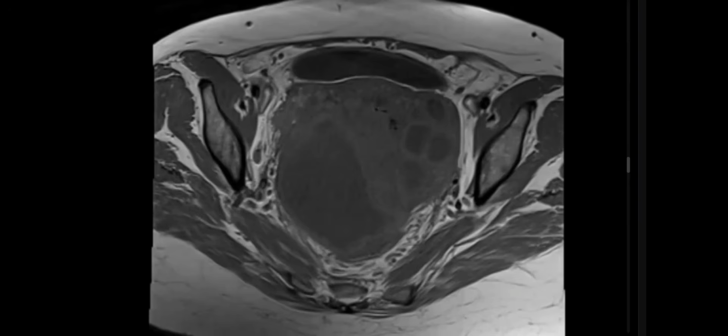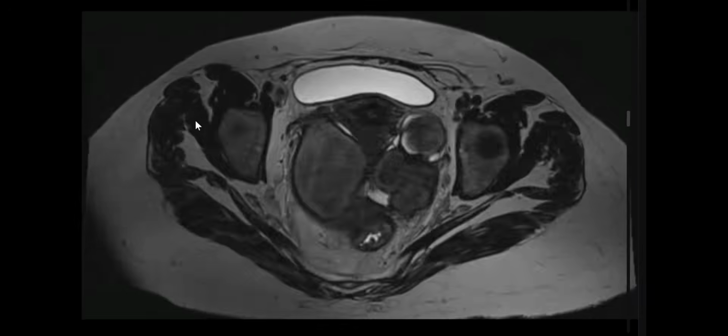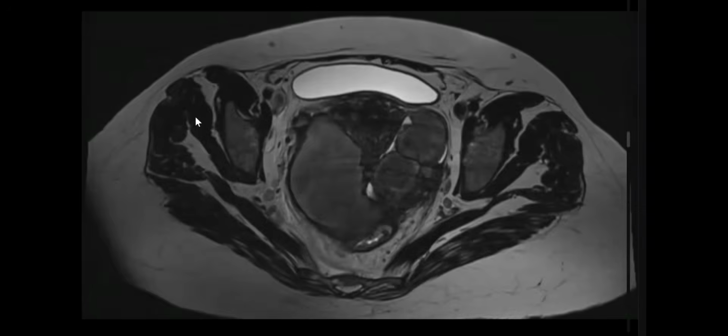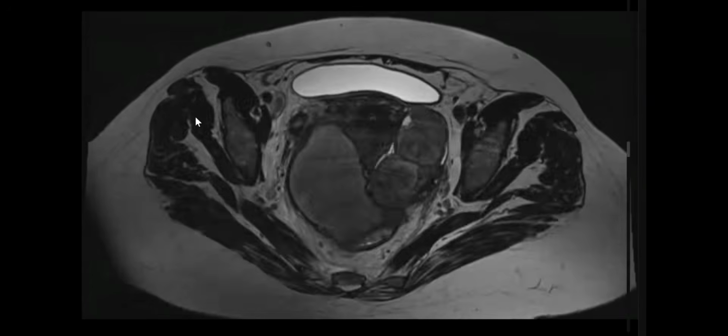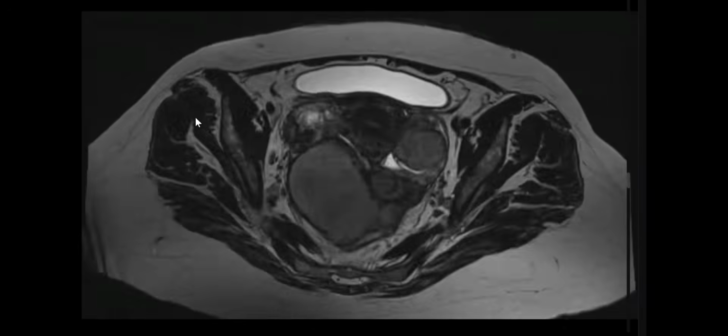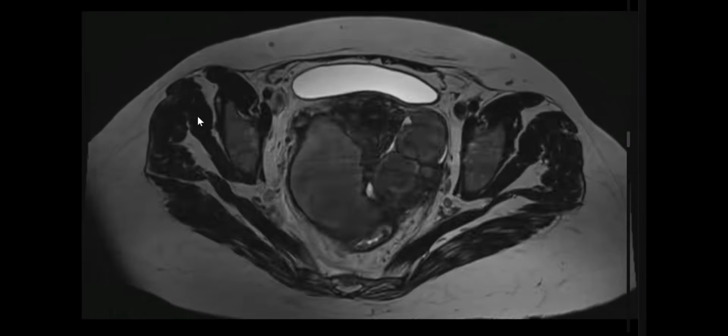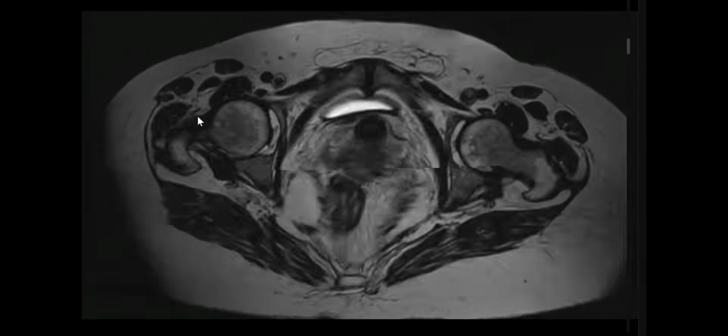I'll give you T2. What do you see, sir? It's not clear. This is not hydrosalpinx. This could be, sir, an abscess.